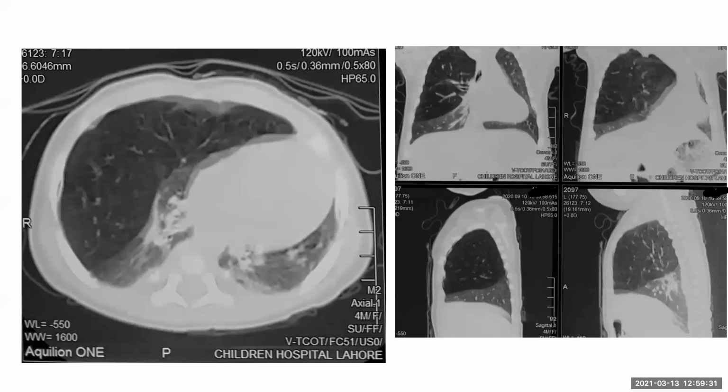So I've been provided with a CT scan of the same patient. It is clearly appreciated that the right upper lobe of the right lung appears to be more lucent as compared to the rest of the lung, and there is also contralateral shift of the mediastinum. These findings are consistent with congenital lobar emphysema, leading to contralateral shift of the mediastinum as well. So I would again convey my findings to the referring physician, as the patient needs further discussion in the pediatric MDT regarding management. Okay.